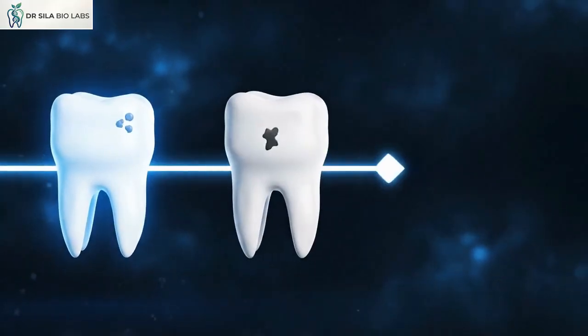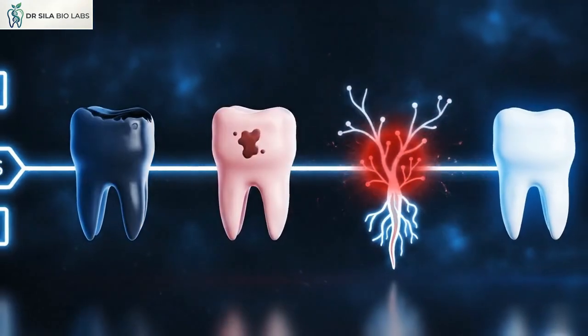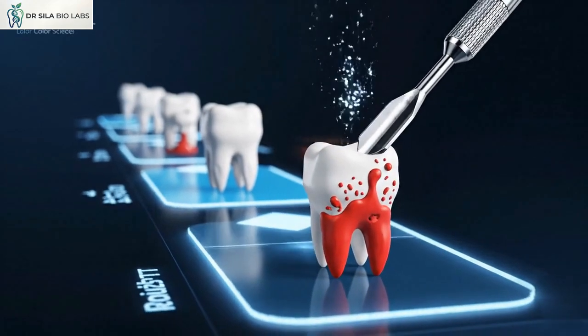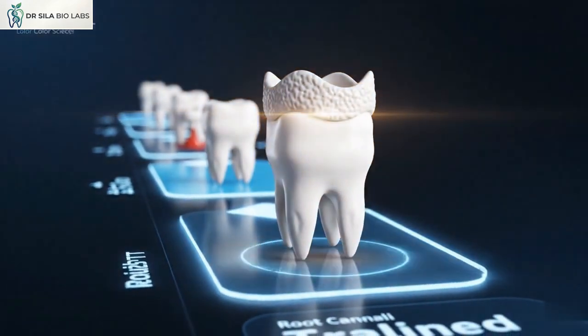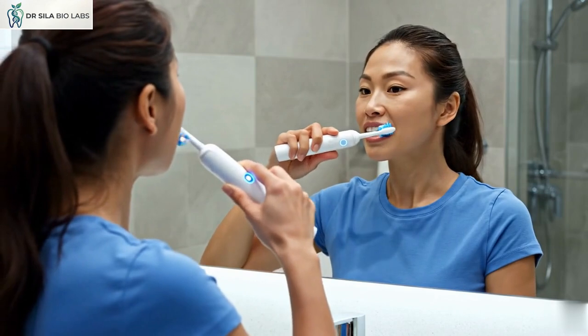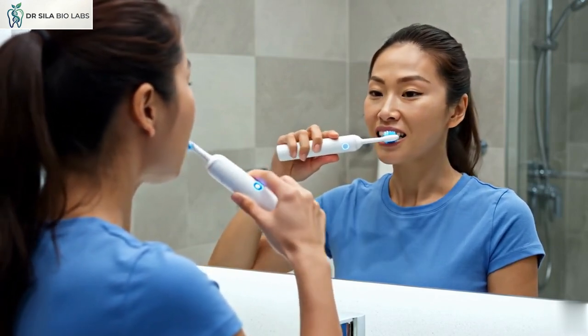We have followed the journey of a lower molar from the earliest stages of tooth decay to the development of a painful abscess. While modern dentistry can often save infected teeth, prevention remains the best approach.